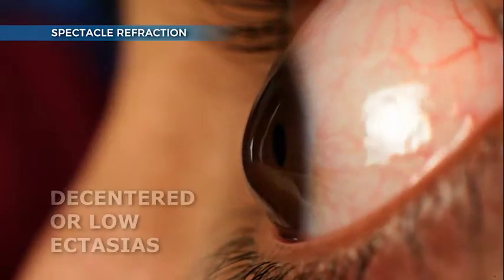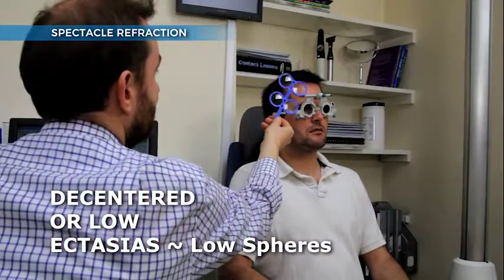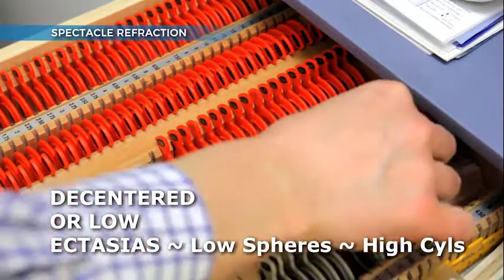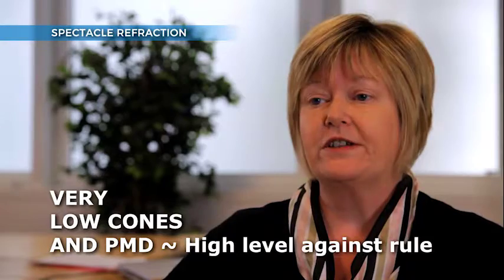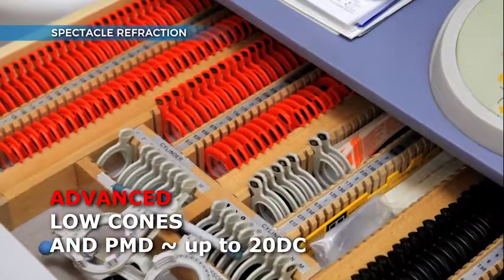For ectasias that are decentered or low, the refraction is usually either low plus or low minus spheres with higher levels of astigmatism in the range of 5 to 10 diopter cylinder. As the severity increases, minimal changes to the spherical component will occur. Very low cones and pellucid marginal degeneration, commonly known as PMD, typically demonstrate high levels of against the rule astigmatism, with severe cases presenting with up to 20 diopter cylinder.